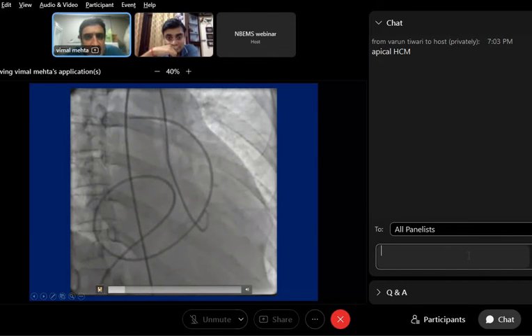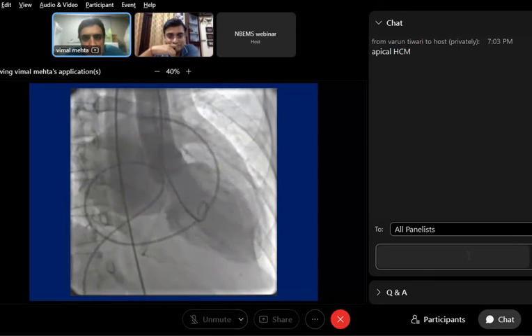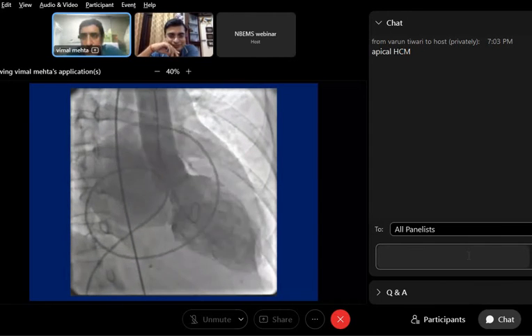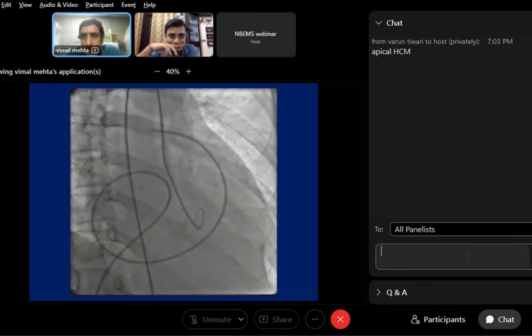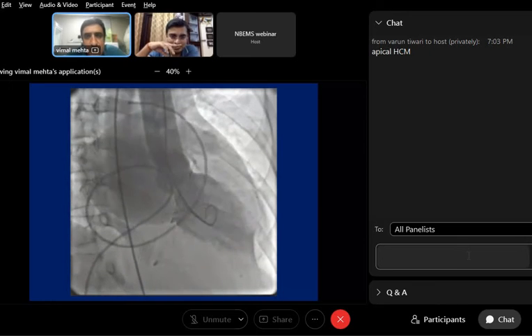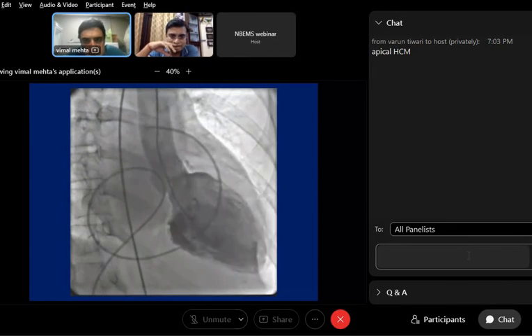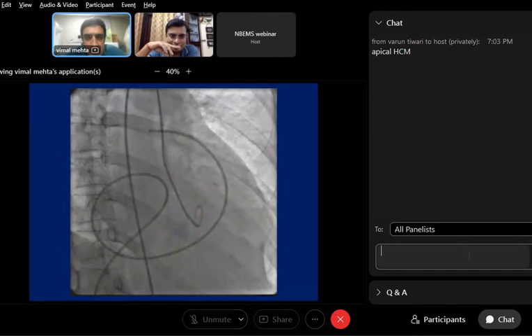Tell me all the findings. All whatever you see. No perfusion in old thrombus. No, thrombus will be layered. Even in acute ones, you will have this kind of picture only. So this is a typically fresh thrombus, the previous one which we saw. Of course, you have to rely on history and all things also. So what all do you see over here?